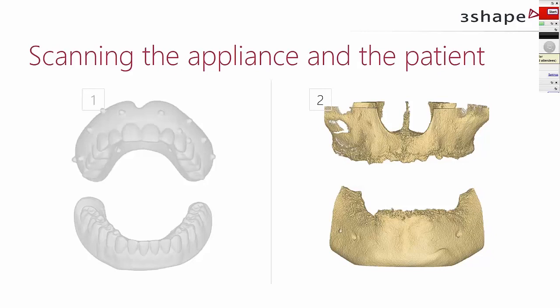And for the whole scanning of things, if you're a new user, then we obviously recommend that you make a couple of test runs, especially on the denture scan, where we don't have to be worried about radiation of patients and stuff like that, because getting the denture scan right is going to be so critical to getting a very nice guide out of this workflow. So play around with it and make sure you have the right settings before you go live, so to say.